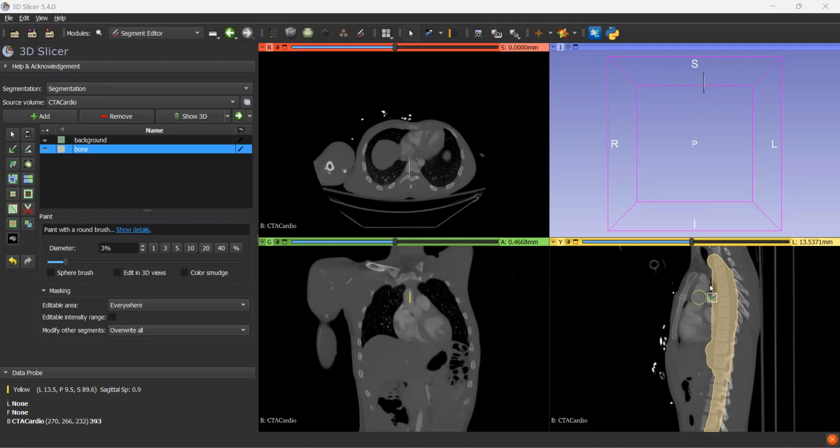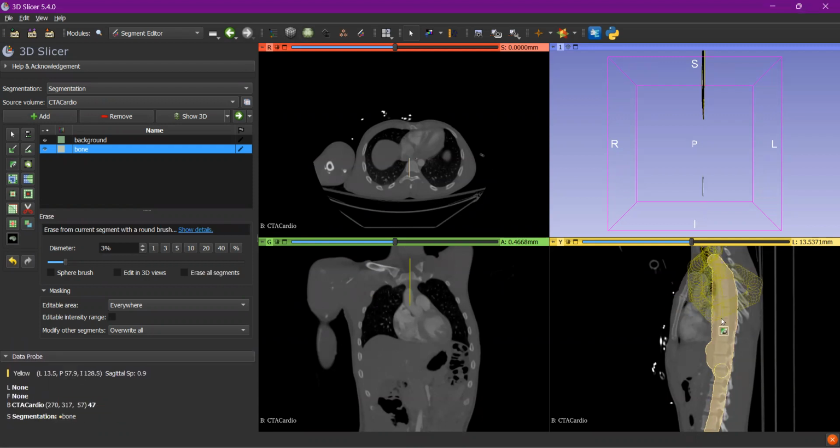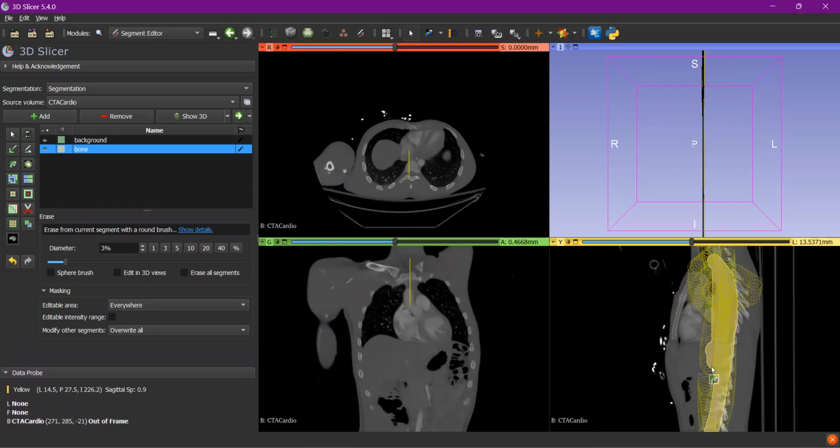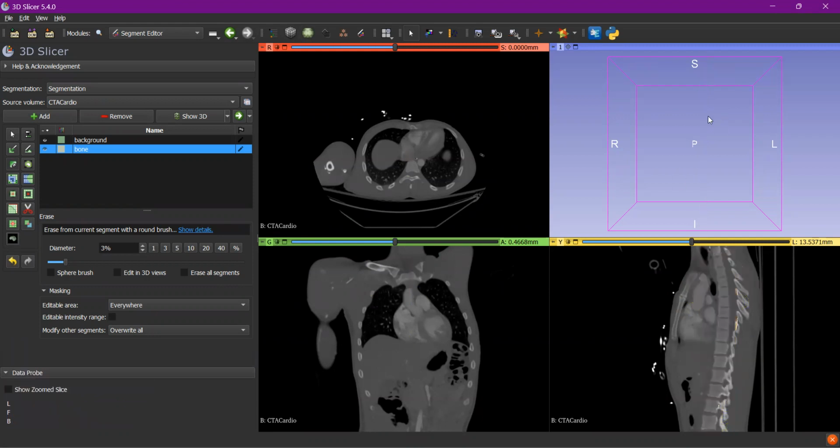As I said earlier, we can segment this by using the manual method, but I'll choose something different which we will be learning from now. So I'm erasing the part. As you can see, initially there is a 3D view, so we'll discuss it again.